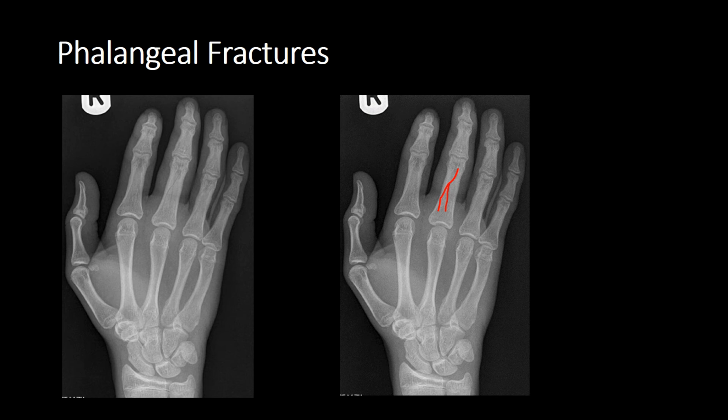Perhaps the most common Mach effect that we are familiar with is the effect of the overlapping incisors on the peg, creating the appearance of a fracture to the peg, and it's not, it's just the teeth.